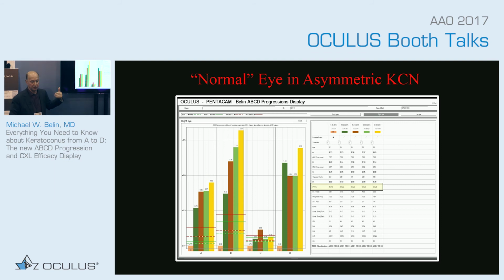Retrospectively, because you can look at this retrospectively, we put that patient in this display, and notice, by the second exam date, this person, still asymptomatic, had statistically significant change in the anterior, posterior, and at the 80% confidence interval on corneal thickness. That would have been the indication to treat. And hopefully you would have treated and not had a 2-line loss of vision.